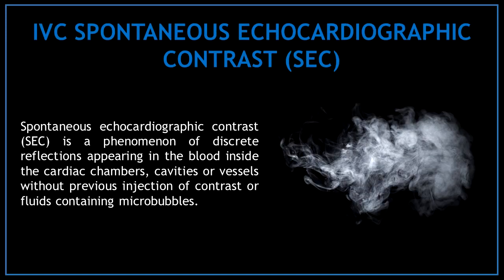Now let's talk about spontaneous echocardiographic contrast. Spontaneous echocardiographic contrast, or SEC, is a phenomenon of discrete reflections appearing in the blood inside the cardiac chambers, cavities, or vessels without previous injection of contrast or fluids containing microbubbles.